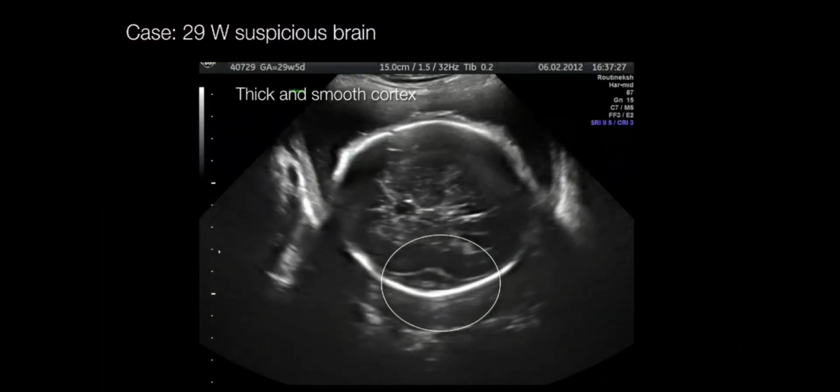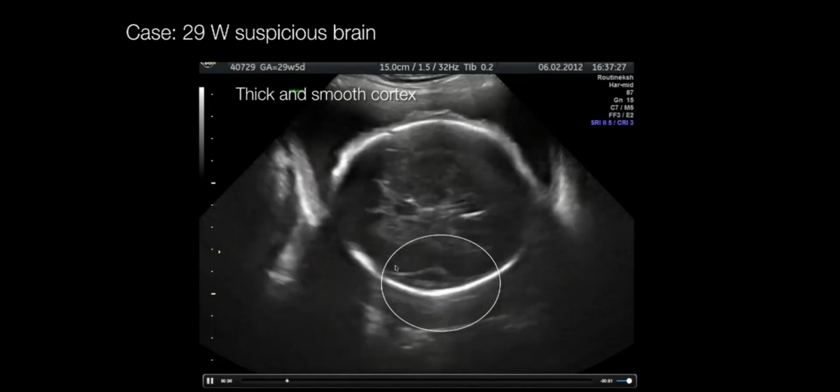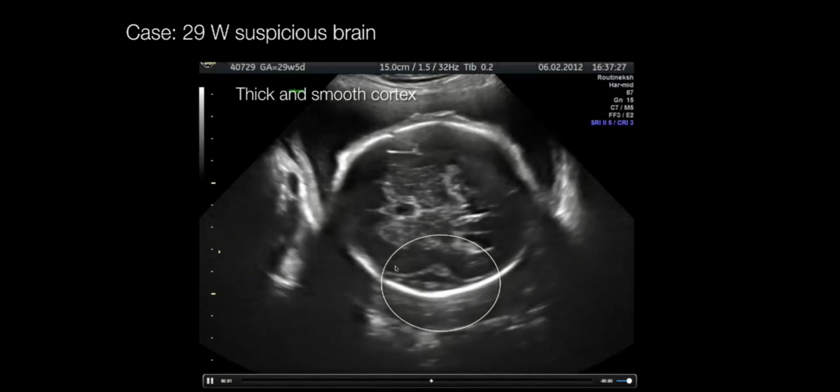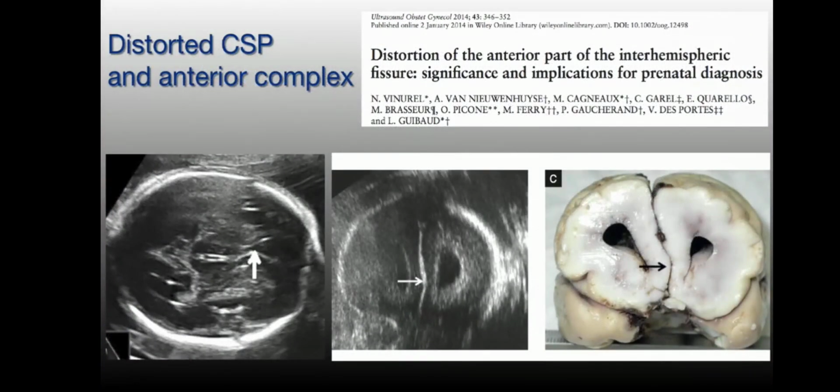But in this case, this is another case at 29 weeks. You see here there is no typical Sylvian fissure, a thickened cortex. The array was normal. And in that case, because it looks like a lissencephaly, you should also seek a point mutation, and this was found in this gene as well. So in cases of lissencephaly, we now have a panel, but at that time we were checking one gene after the other. And this is one case with a deletion, another case with a mutation of the LIS1 gene.